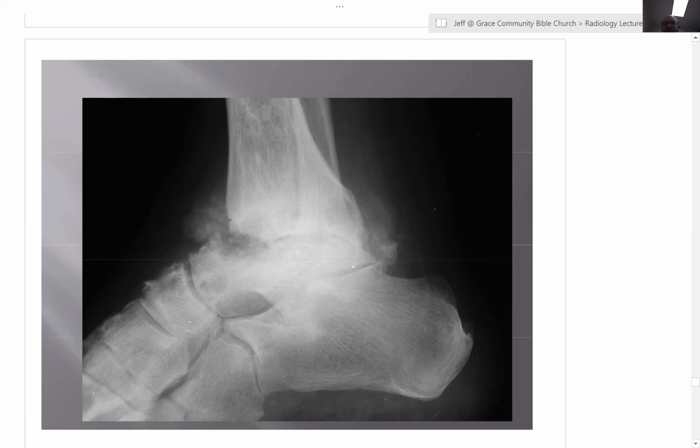You know, we put our heads together, and it's amazing what we can get at. Take a look at this. This is great. Look at this. I don't know if you can see it, but there's some soft tissue atherosclerosis of a vessel superimposed on the calcaneus, which can happen in diabetes. So it's a fun little finding.